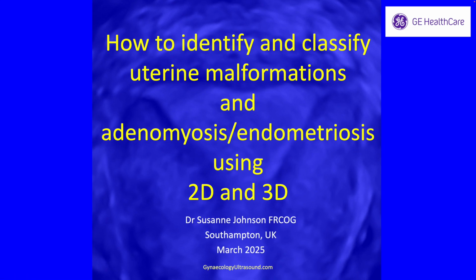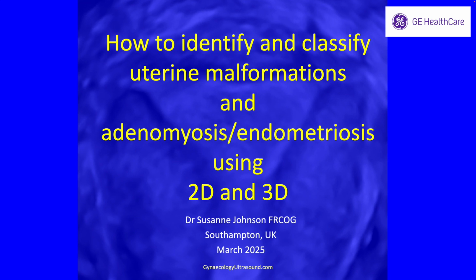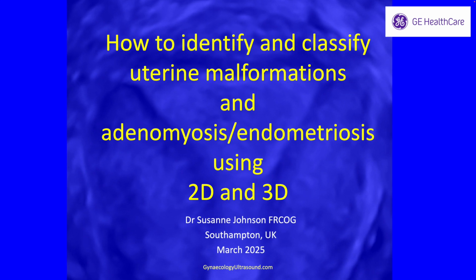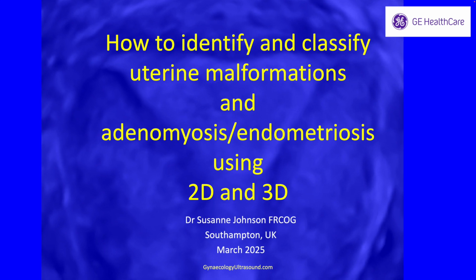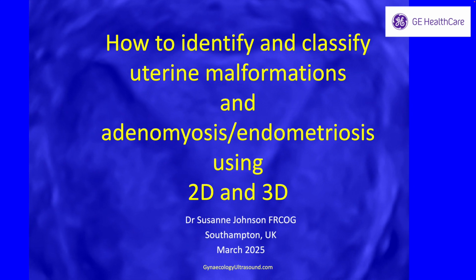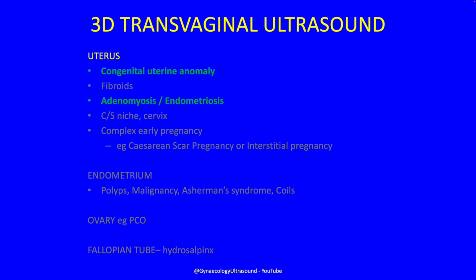Hi, this is a video on how to identify and classify uterine malformations and adenomyosis and endometriosis using 2D and 3D ultrasound. My name is Suzanne Johnson and I'm a gynecologist from Southampton. 3D ultrasound has a lot of uses, but in this talk I'm going to limit the discussion to congenital uterine anomaly, adenomyosis and endometriosis.